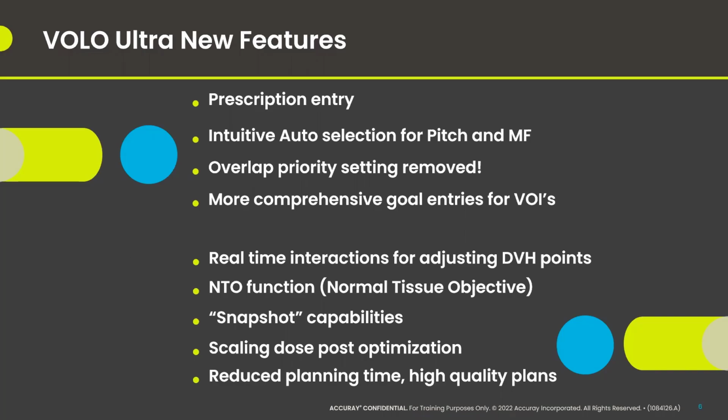Okay, so for this last one, I added this as a feature because in all reality, it's an awesome change. By having these new added features along with our new optimizer, it can reduce your planning time significantly. Not only does this new optimizer reduce the time, it will also be working behind the scenes to find the best solution to give you that optimal, high-quality delivery plan.